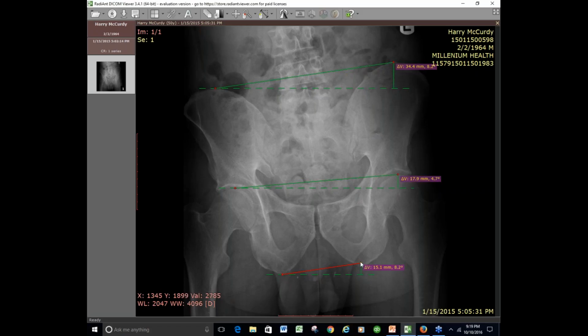So we were down here. And let me go back to the bottom, 10.8. That's about where his bottom number was. And at 10.8, like right now, if he sat down, the whole pelvis would drop 5.9 degrees, right? Because he'd sit on a level surface, right? So that whole thing would drop.